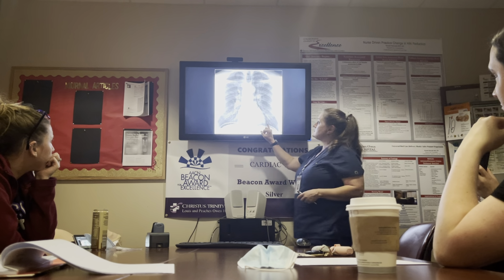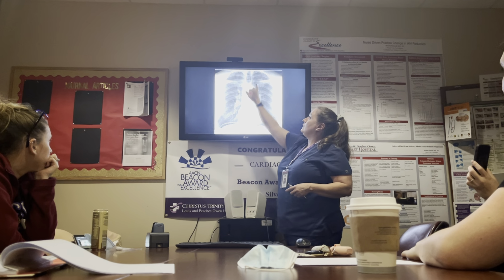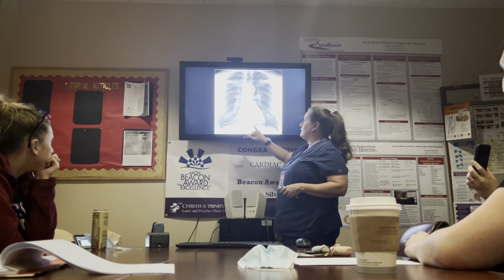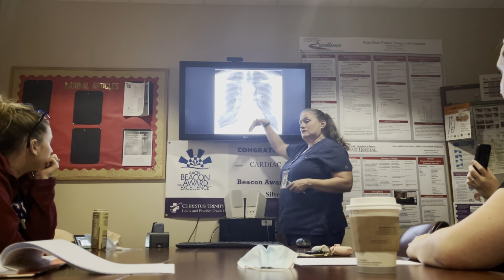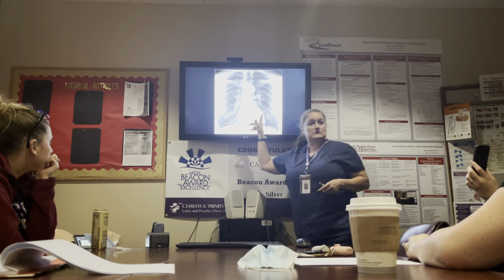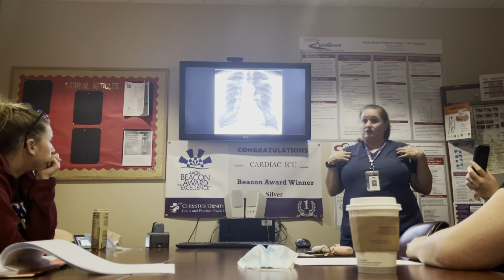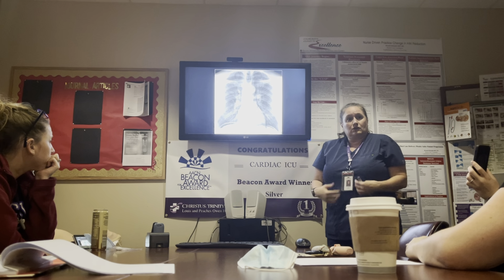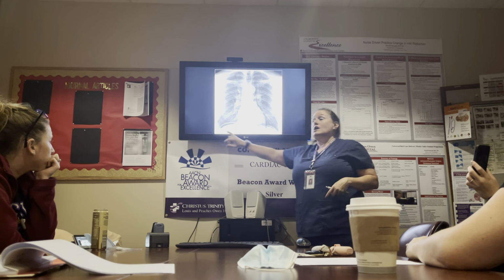And the reason being is there's a clear stripe of air that goes pretty much all the way up. So that's air in the mediastinal area, okay? It's not compressing on the heart, and it's leaking down. So it's either going to be that it's gone down, okay? So sometimes when a patient who has asthma, say, pops a bleb in their airway, and it's central, it's not a pneumothorax, the lung doesn't go down, but it stays central, it's going to go down through the diaphragm potentially, and you might have air under the diaphragm.